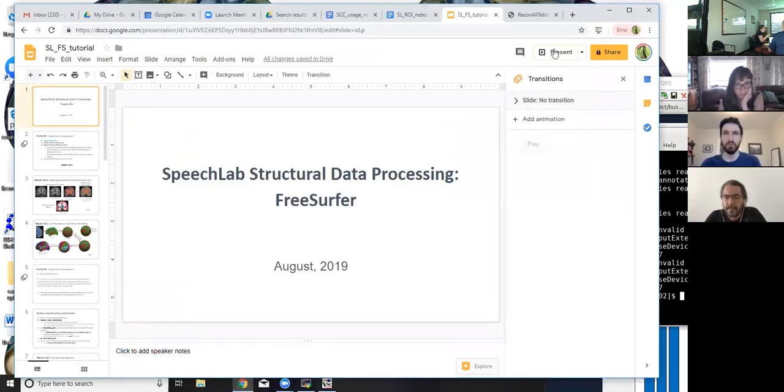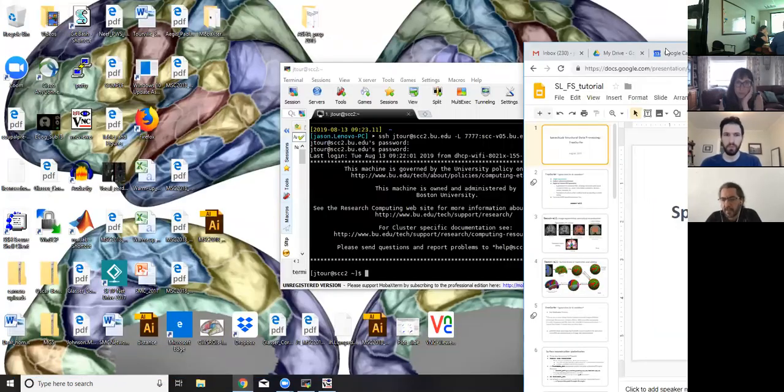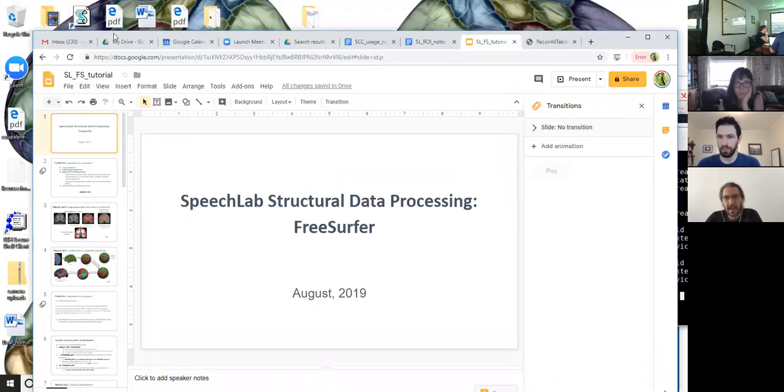Like just within my ROI area, so not necessarily the ROI analysis, but just within the areas that I'm looking for as ROIs, do that same thing. So instead of counting the number of suprathreshold voxels within the left hemisphere and right hemisphere, just count them within pre-specified ROIs, is that the question? Yes. And then run an ROI analysis.